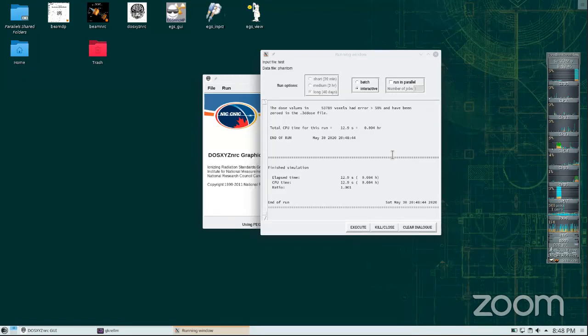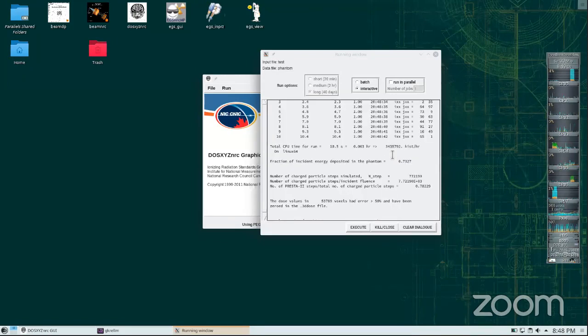So this is the dose XYZ code I just gave you. The physics should remain the same, like what we have explained with the dosrznrc, but the geometry is a little bit different, and this is probably a geometry that we want to explore.